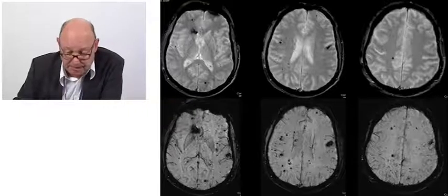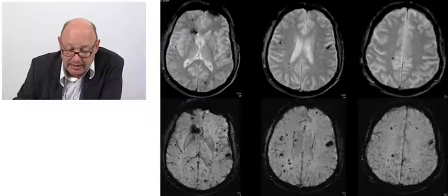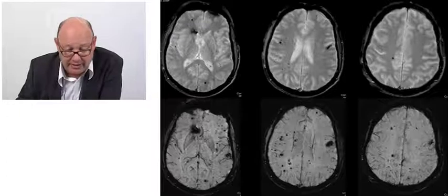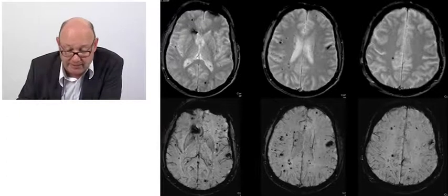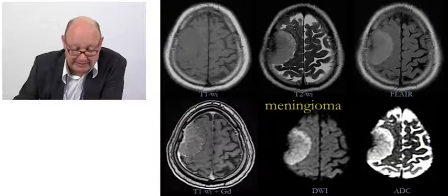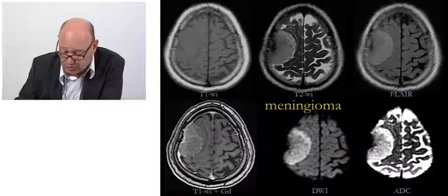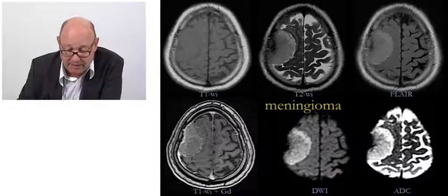And actually this is a patient who had a bleeding in a cavernous malformation with a second cavernous malformation over here. So we also performed MR imaging of the brain. This is, again, the gradient echo T2 star weighted image, where we see numerous hypo-intensities, typically for a patient with cavernous malformations, and this in a familial form.